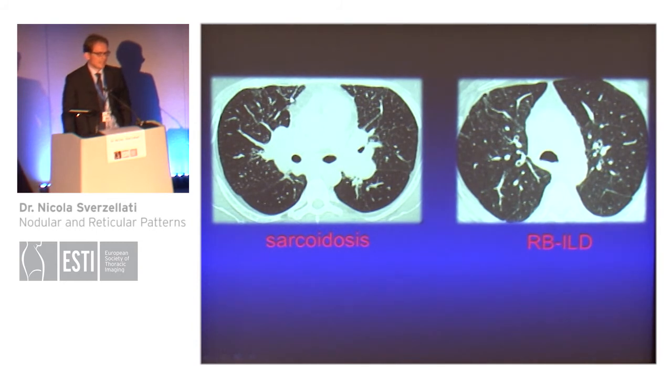Interlobular thickened septal lines can also be observed in many other lung diseases as an ancillary feature, as an occasional feature. You can see here in this example of a patient with sarcoidosis some septal lines in the ventral portions of the upper lobes, but you can note here that there are some nodules involving the fissures and bilateral lymphadenopathy. And this is another example of a patient with respiratory bronchiolitis associated with interstitial lung disease. You can note patchy ground glass opacity, centrilobular nodules, bronchial wall thickening, a bit of emphysema, and a few septal lines.